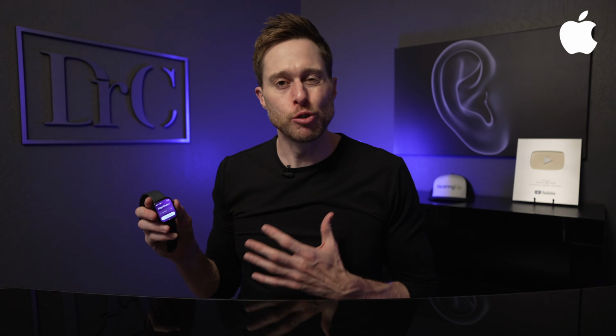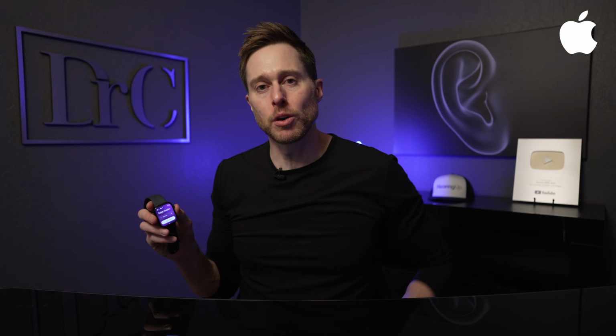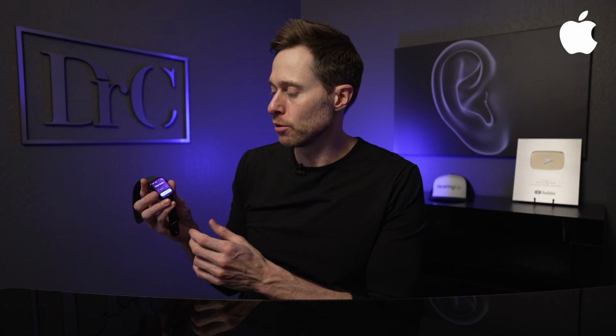So to use the Apple Watch, you do have to have your phone in your vicinity, but you don't actually have to pull it out of your pocket. You can do a few things here right from your wrist, and you can also see your battery life and the time there as well.